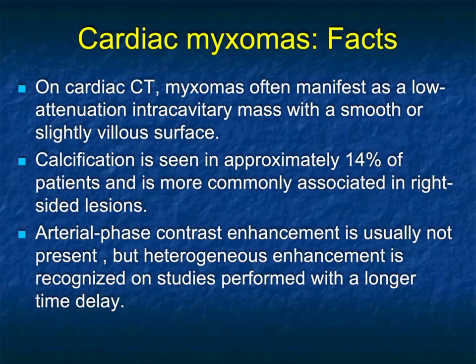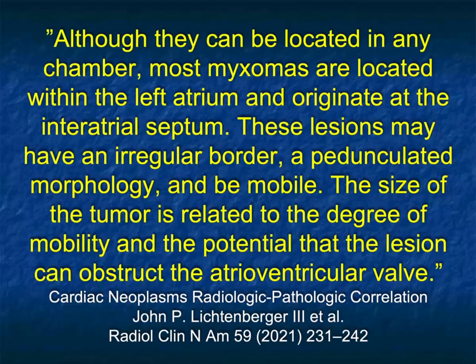On cardiac CT, myxomas often manifest as a low attenuation intracavitary mass with smooth or slightly villous surface. When it's perfectly smooth, it makes it a bit easier, particularly in cases where you're trying to distinguish it from a thrombus. Calcification is seen in about 14% of cases, and more commonly in right-sided lesions. Arterial phase contrast enhancement is usually not present, but if you had delayed phase, you might see a little bit of enhancement. So myxomas are not hypervascular tumors.